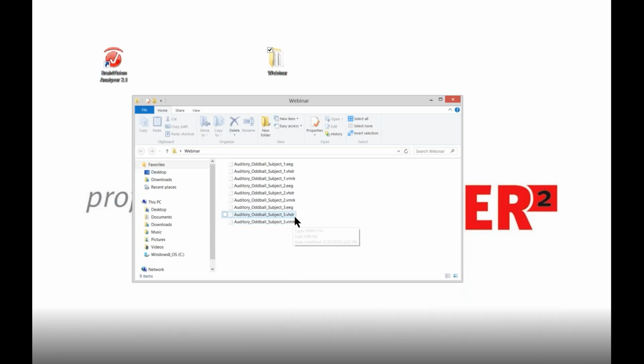To create the workspace and the workspace folders, I first create a folder and I call it raw data. Let me copy in the recordings of subject 1 and 2 for now. Secondly, I create a folder called history. For now, this folder remains empty.